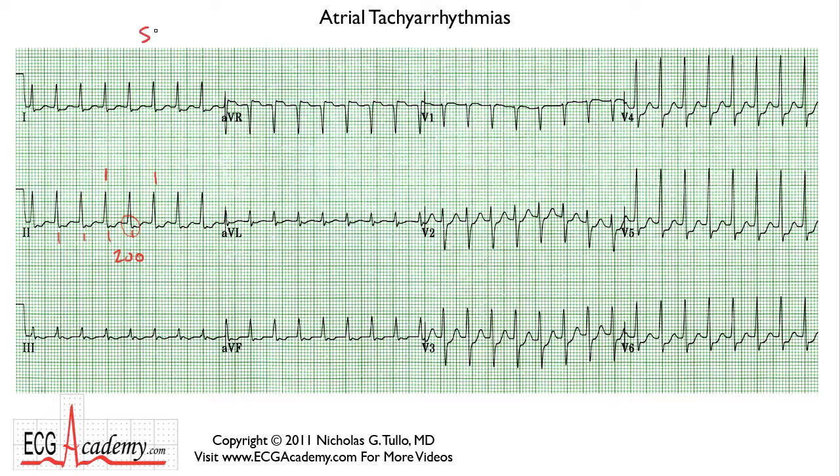So you would call this supraventricular tachycardia. If the patient described that it started suddenly and he came to the emergency room and got an injection of something like adenosine or diltiazem and it breaks suddenly, then you would call this paroxysmal supraventricular tachycardia. But again, that's a diagnosis that's kind of based on the behavior of the arrhythmia. It's more of a clinical diagnosis. The electrocardiographic name for this would be SVT. You don't see those discrete P waves in front of each QRS complex, so atrial tachycardia would be less appropriate under these circumstances.